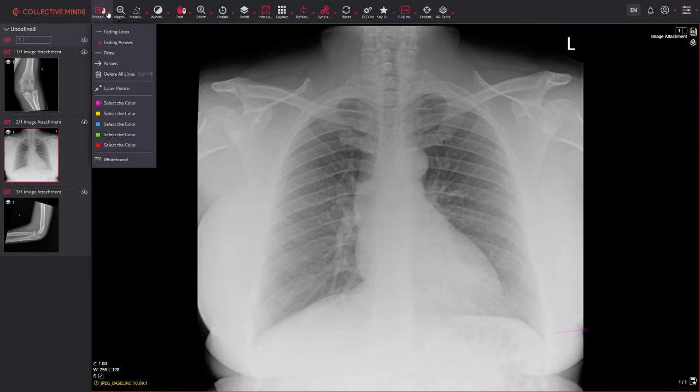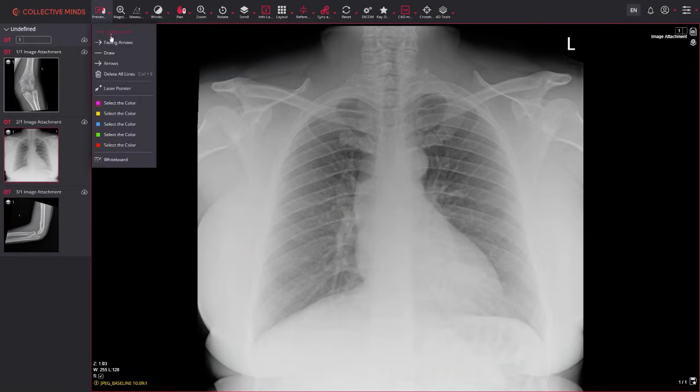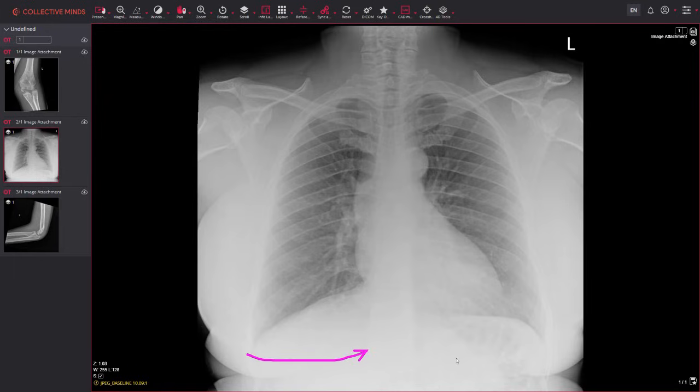I would say probably maybe at this top end, we're probably looking for about here. I don't think we need as much neck there. And similarly down here, if it was sort of cut off to down here, that's fine. You want a little bit of subdiaphragmatic region. Again, for some patients, there may be perforation. And also what you've got to consider is, guys, that the lung actually comes down here. Hemidiaphragm obscures that. And sometimes, if we're not careful, we can cut that off. So it's just an important consideration. But on the whole, we're not doing too bad here. We've got all the areas that we need to see.